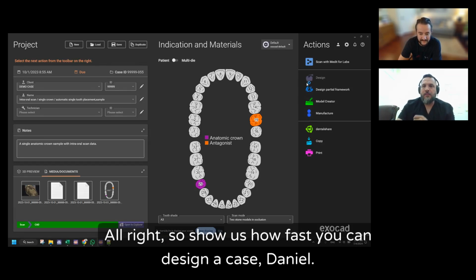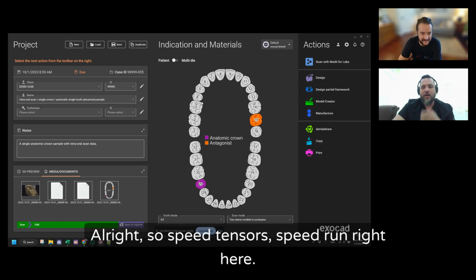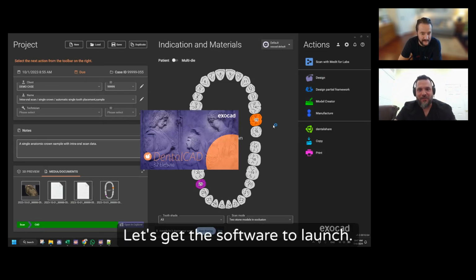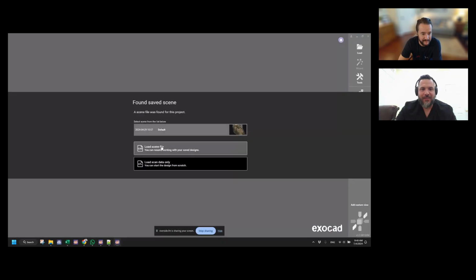All right. So show us how fast you can design a case, Daniel. All right. So speed test, speed run right here. Speed run. Let's see what you got. All right. Let's get the software to launch.